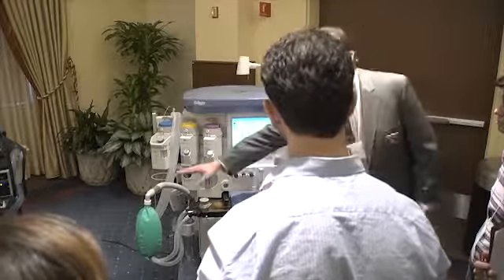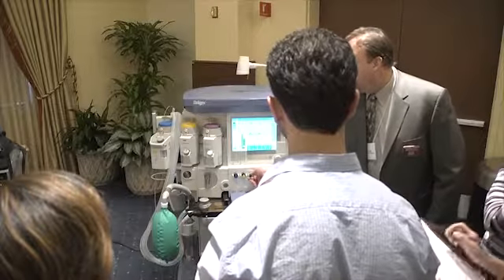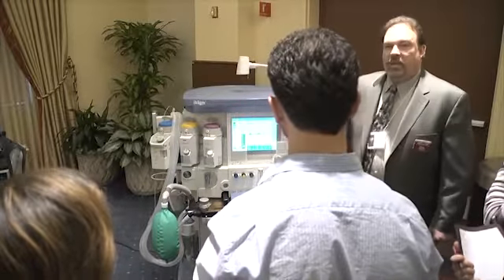This is where fresh gas decoupling comes into this type of anesthesia machine. Whereas that machine's fresh gas flow went into the breathing system directly during the entire inspiratory phase and expiratory phase, it's always being added in. This machine does not. So during the inspiratory stroke of our ventilation, you can see that this bag will move. That fresh gas flow is being held in there while the piston is delivering your set tidal volume. And I'm going to show you that as I increase my flow, it really has no effect on my tidal volume delivery.